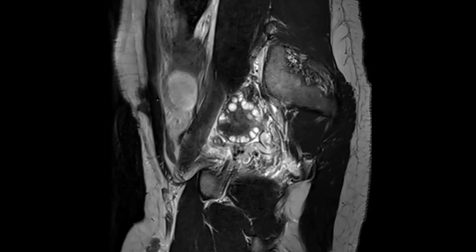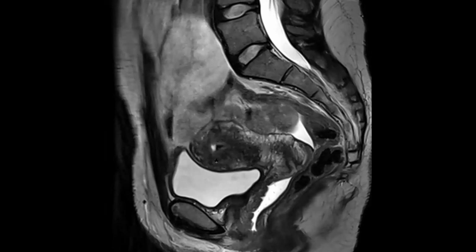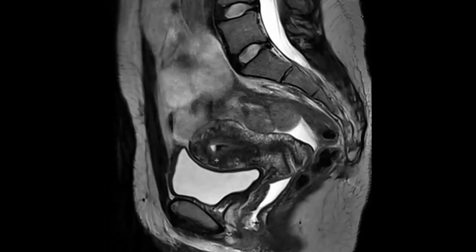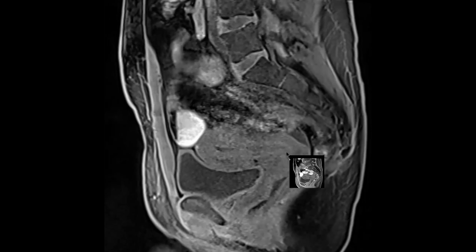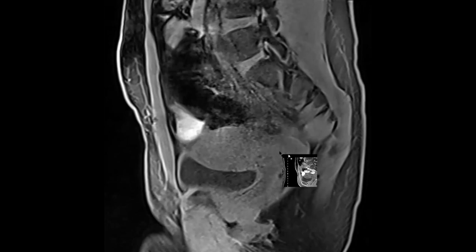So this is a great example of endometriosis. The patient has pretty significant adenomyosis, and there's scattered DIE elsewhere, very minor though, very little burden. It's hard to see the C-section scar, but you can see it much better on the pre-T1, where there are susceptibility artifacts right there. But this is a companion case for abdominal wall DIE. Patient with prior C-section.